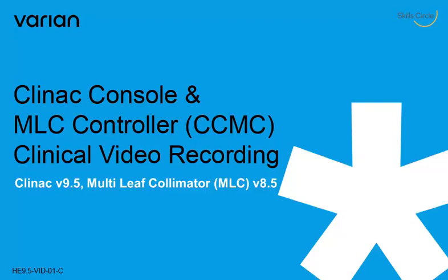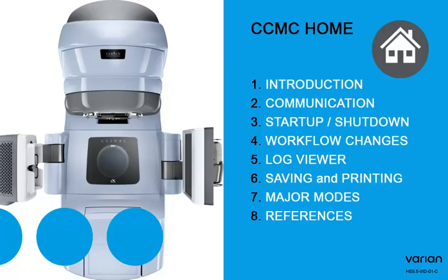Welcome to the video recording for Clinac Console and MLC Controller, CCMC, Clinac version 9.5 and Multi-Leaf Collimator version 8.5. For Clinac Console and MLC Controller, CCMC, this video covers the following: Introduction to CCMC, Communication, Startup and Shutdown, Workflow Changes, a new application log viewer, saving and print options, major modes, and references.